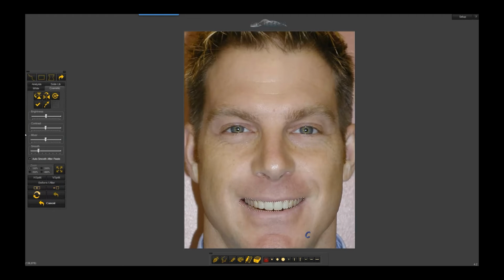Very cool. DDS is designed to allow you to close more cases. That's a unique thing that separates us from the other software. Most of the other softwares are like a glorified X-ray view box. Our product does all that as well, but it's also designed to help you close more cases. Closing cases is good. So it makes the whole world of dentistry go around. All these features are just built into it, so there's actually a return on investment on our software, unlike most others.